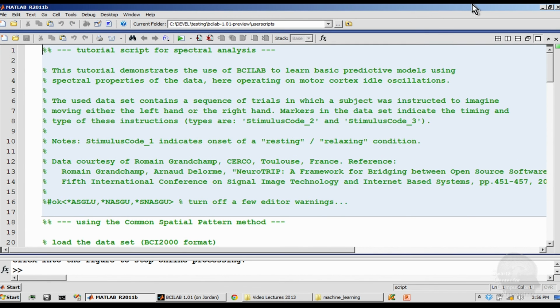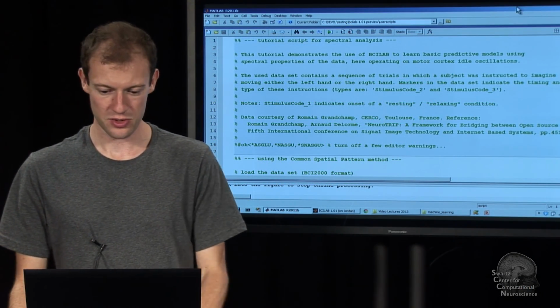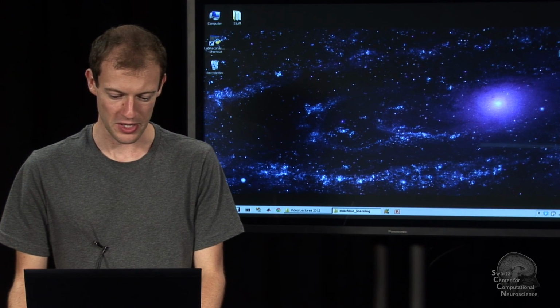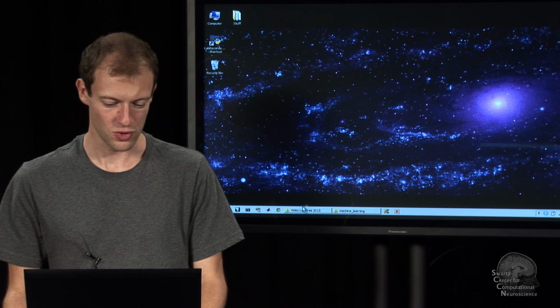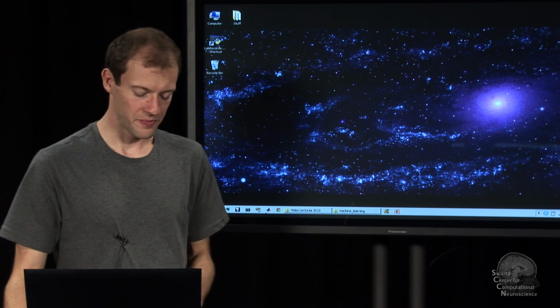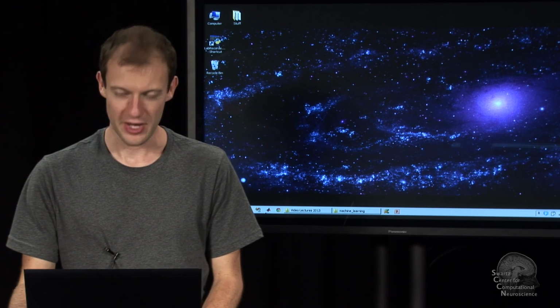So we've covered the GUIs, the scripts, some of the plugins. Obviously, there's a lot of stuff to discover, but there's no way that I can really go over all these things in the short time that we have. So I think that's sort of the end of this little demo.